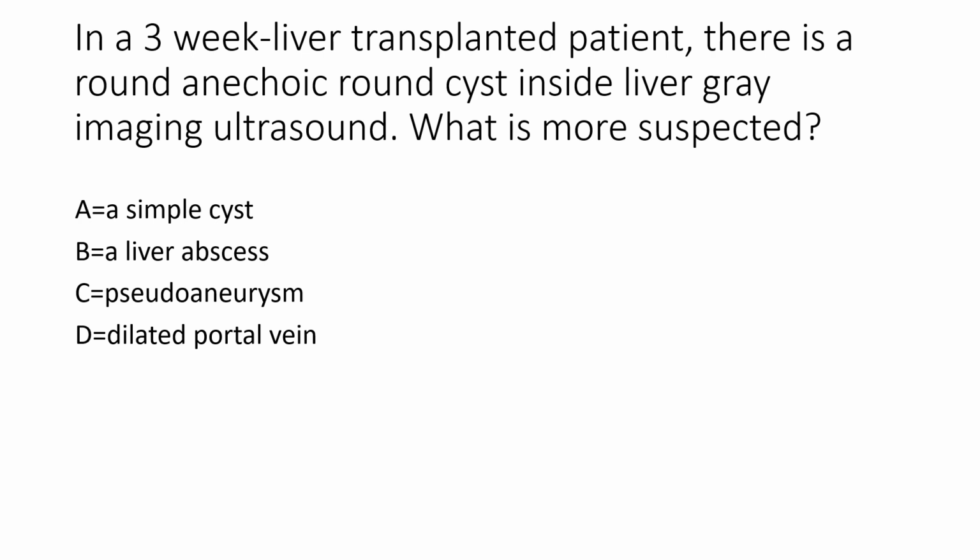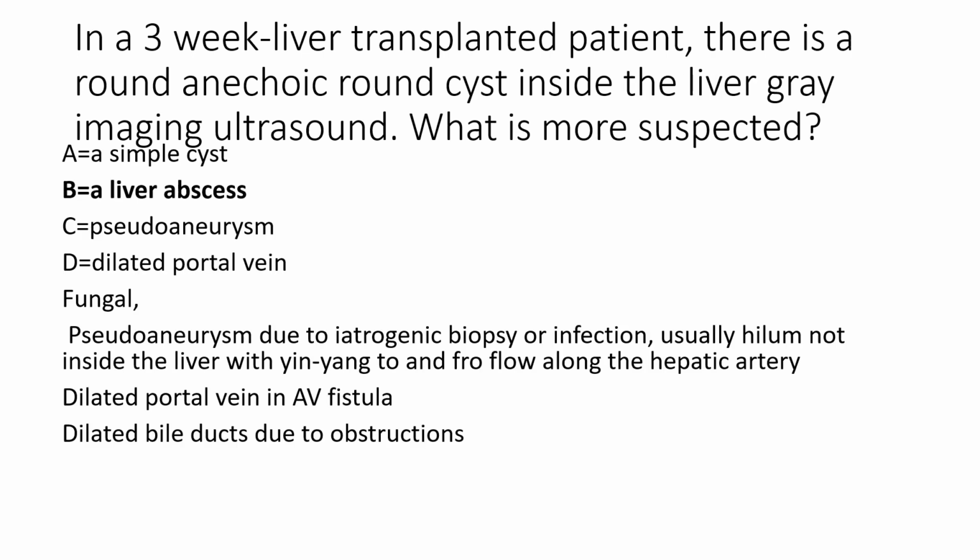In a 3-week liver transplanted patient, there is a round anechoic cyst inside the liver on gray imaging ultrasound. What is most suspected? So the patient with a liver transplant is a special patient with immunosuppression and many complications of the bile ducts. So we should forget simple cysts.